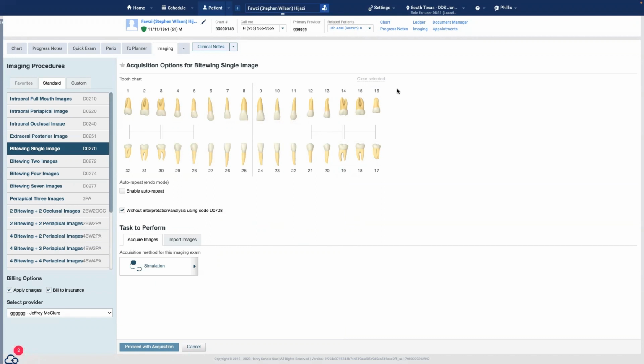But the point you were trying to make, and I want to tell people, is that this AI actually works on all of them. It treats it exactly the same. You don't say, oh, this one works for this sensor, but doesn't work for that. If the image can be incorporated into Dentrix Ascend, the AI will analyze it. I even have a ScanX phosphor plate system, and it works perfect on it. And our old x-rays, like I tell the hygienist, hey, go back to 3 years ago when we took bitewings and let's analyze it. And then we'll analyze that as well.